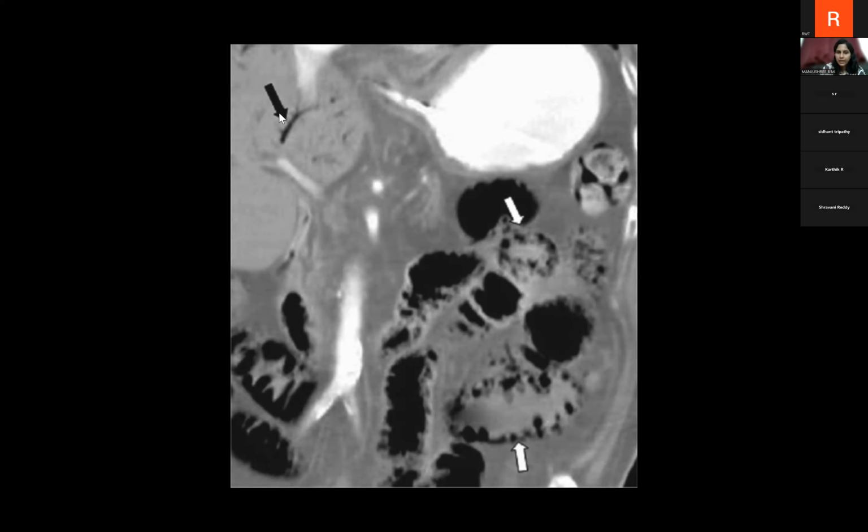If it is air in the liver, there can be two things. Air can be in the portal vein or in the biliary structures, that is pneumobilia. Now, how do we differentiate between portal venous gas and pneumobilia? Come on, students, I want the answers. Yes, peripheral is portal venous gas. How do I remember? P for P: portal vein, periphery. So this is portal venous gas, and here we have intramural gas. Both of them put together, it is bowel ischemia. Very good.